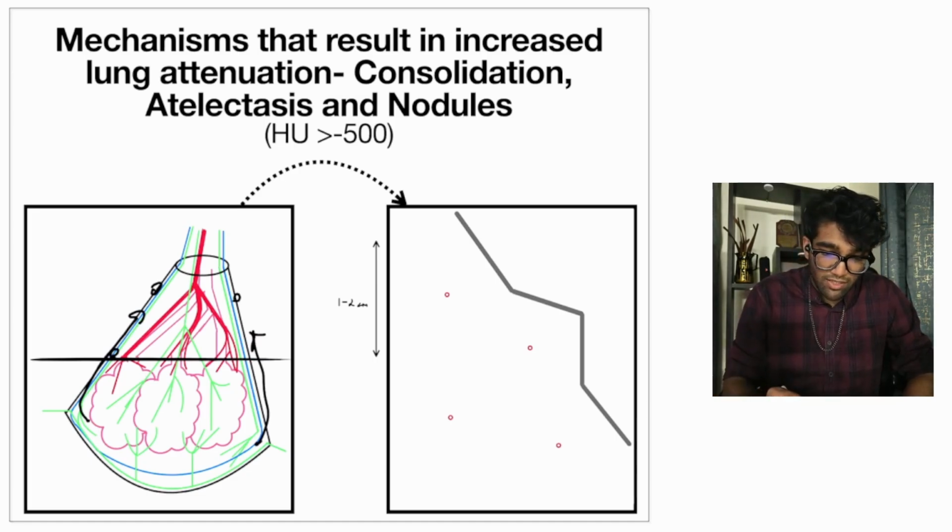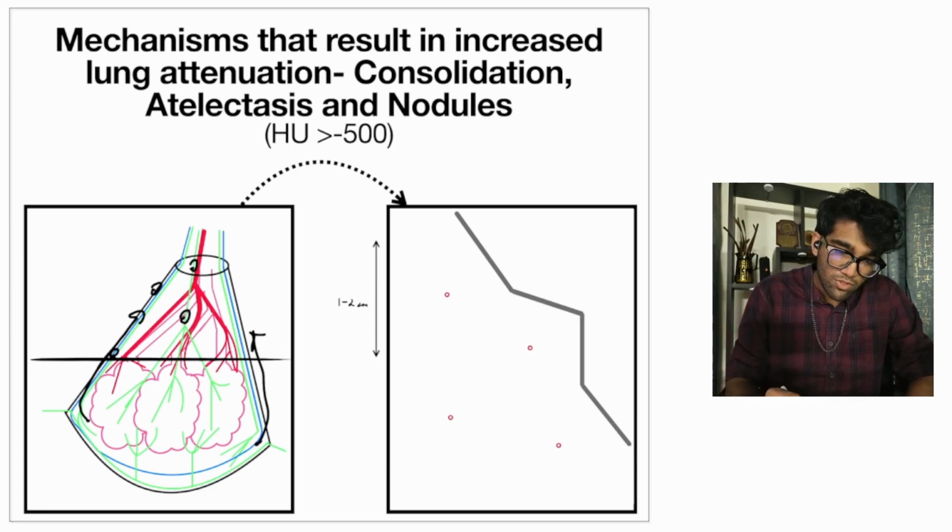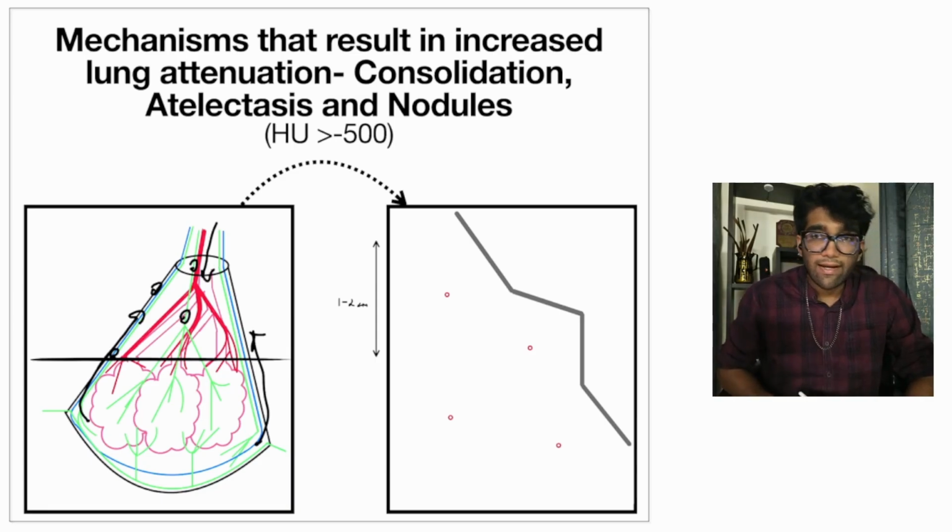They would also get stuck in the center because the lymphatics also extend through the center. Okay, so that would be another pattern. On the other hand, if something was coming in through the respiratory tract, it would get stuck within the respiratory tract. Now importantly, the respiratory tract is here, the branch is here, but we can't really see it.